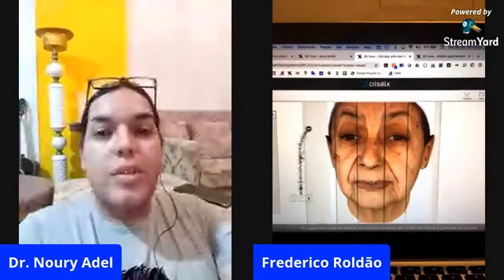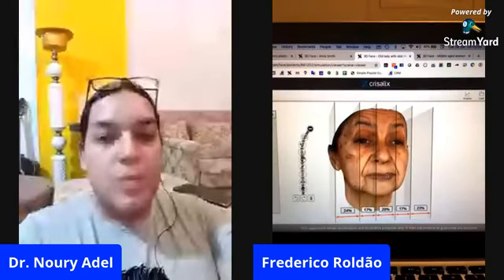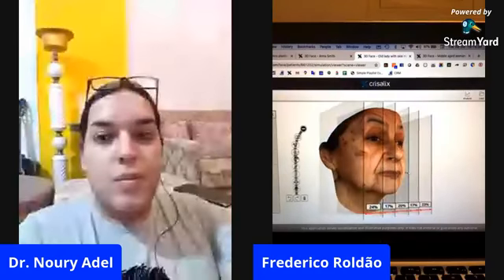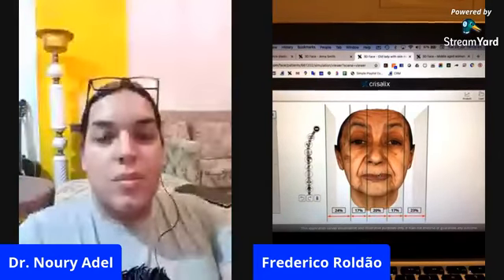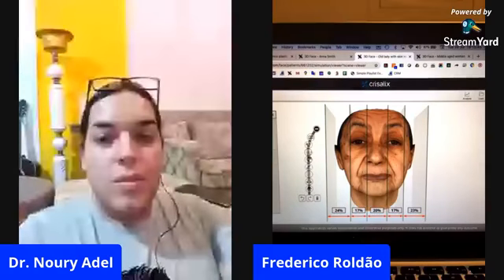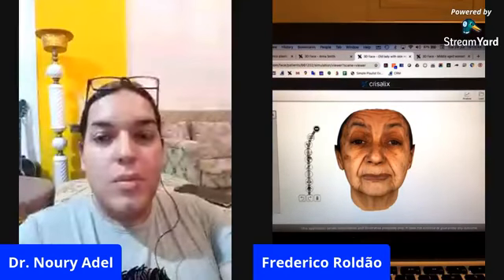Yeah, perfect. This is your rule of fifths here. But we have something even better, because this is just analysis, this is just evaluation.